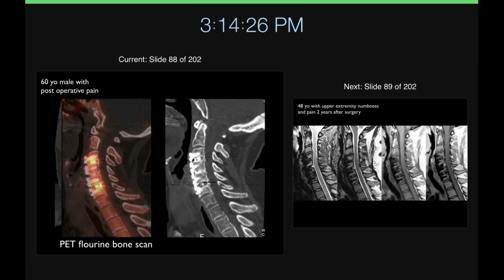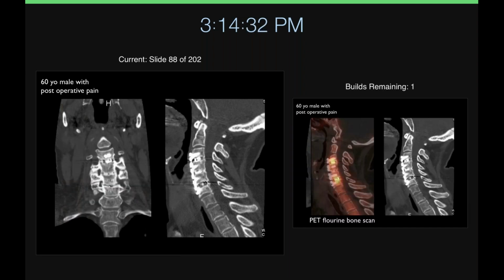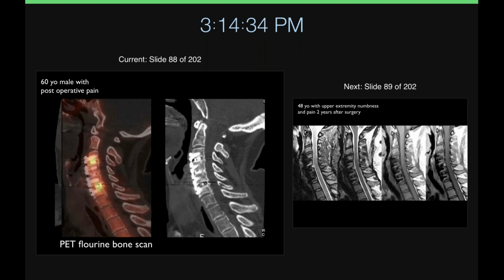How long after surgery is this? A while. I don't know exactly how long, but not immediately after surgery. So I guess depending on the time frame, you wouldn't necessarily expect to see active bone formation surrounding the hardware. So that would indicate that it's probably loose. Yeah, so the hardware's probably loose. Probably that's what the feeling was.